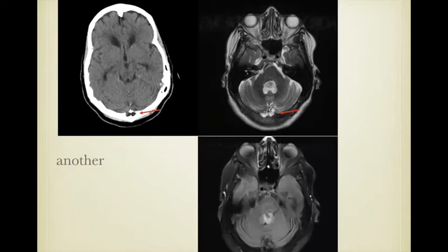Now, there's one other consideration I will give you: very rarely in these pockets, you will actually see brain. These are called intradiploic encephaloceles, and these can be the source of seizures. So if you have a patient with unexplained epilepsy that's not of temporal lobe origin, and you see these pits in the skull, again, look carefully on the MR scan to determine if there's brain extending into those pockets. I honestly have never seen a case in my practice of one causing seizures, but I've rarely seen these intradiploic encephaloceles.